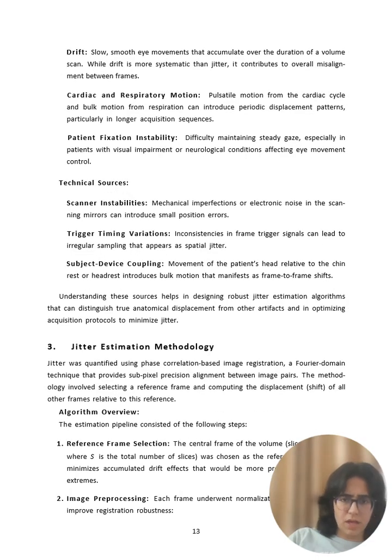So now we move on to estimation of jitter in OCT images. Jitter is basically small line movements that cause misalignment between consecutive B scan frames. Now we need to understand what jitter in OCT scans will do and how we need to correct it. It refers to small random displacements between consecutive frames, and unlike systematic drift or large cyclic movement, it is on the order of a pixel or very small movement, just a few pixels in the horizontal or vertical direction.